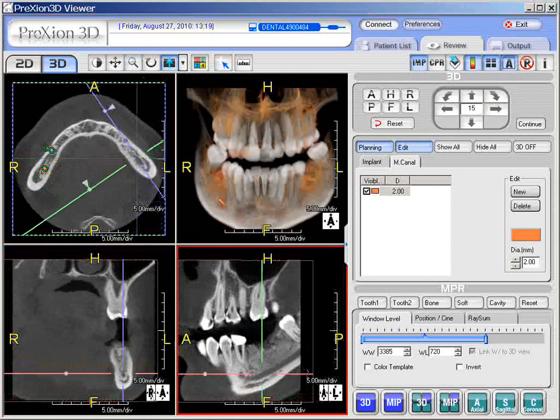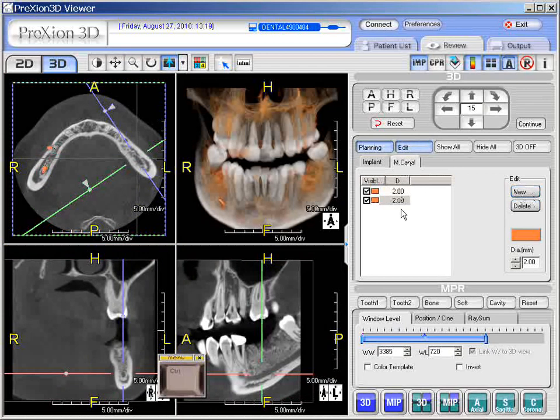So once again, in review, hold the control key. Now, look, we have got to go to a new side. So we've got to click, M canal is already selected, hit New. This is important. So now we've got the new side, which is the left side.